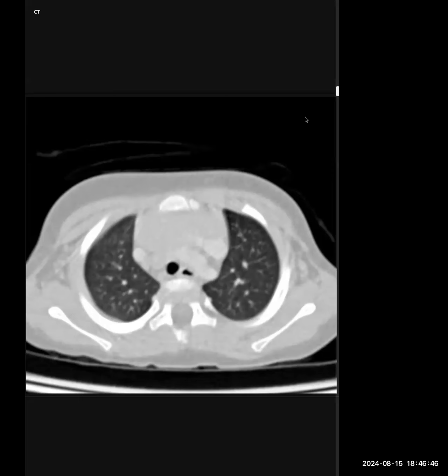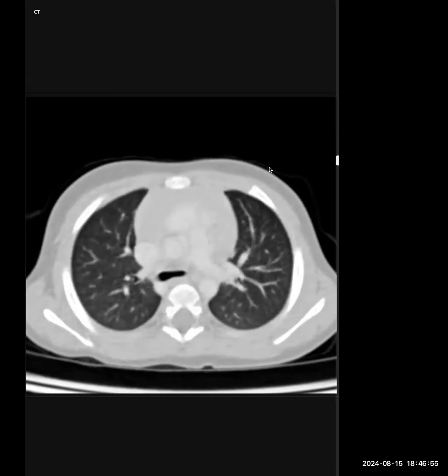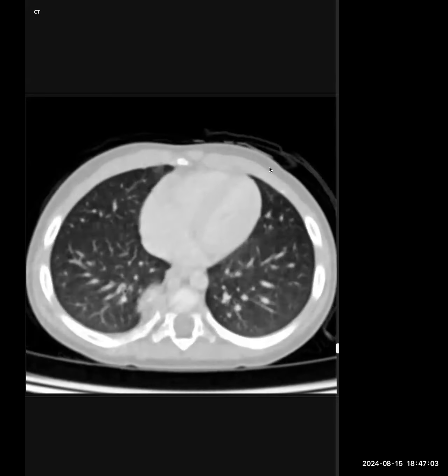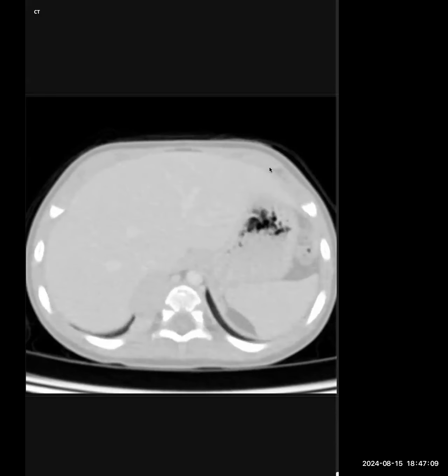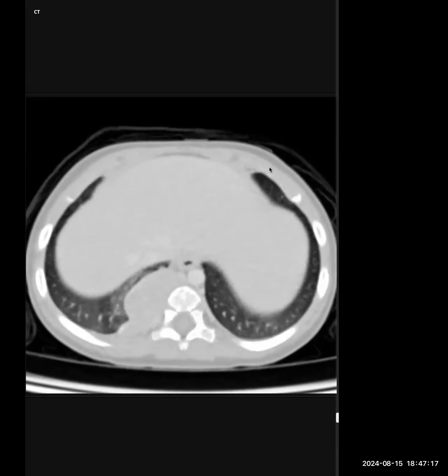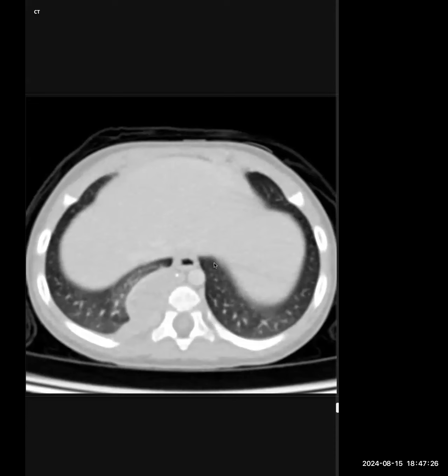Okay. Here you go. So I'm presented with the contrast enhanced CT scan of the chest of a 1-year-old child in lung windows. I'll first scroll through the scan to see the findings. So I can see that there is a destructive lesion along the right paravertebral space, which has some internal calcifications within.